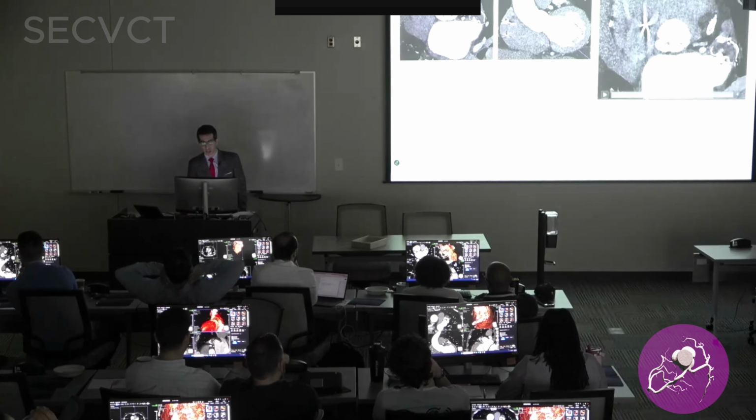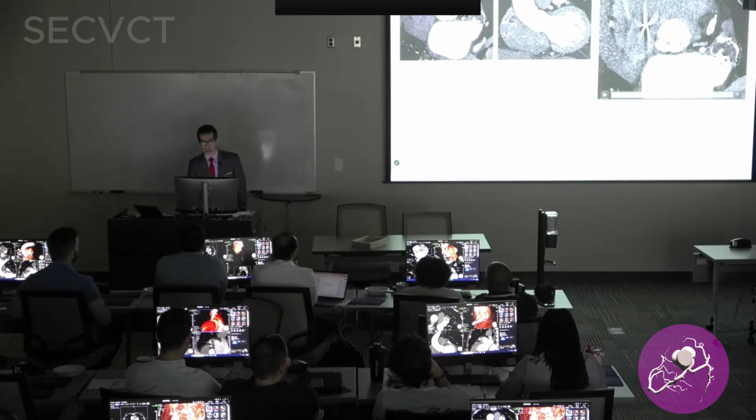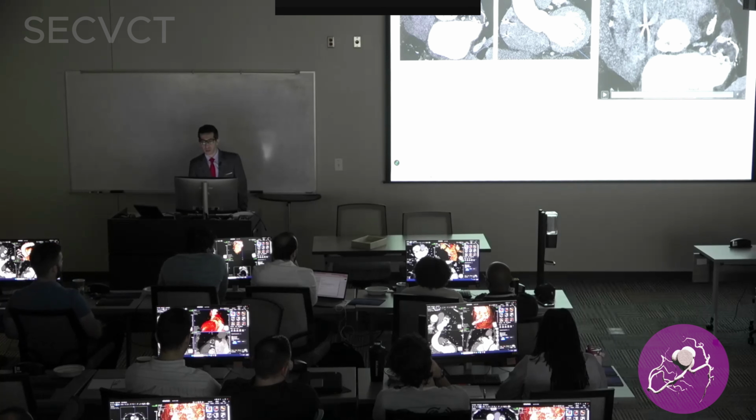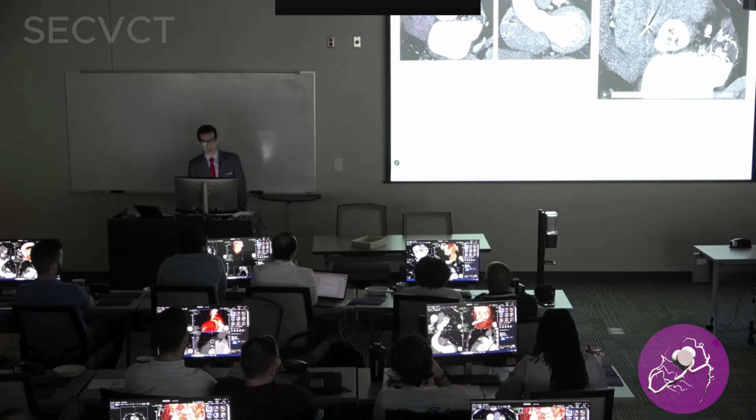By the way, this was done for aortic regurgitation. Unfortunately, the phase that was saved is the systolic phase. But I want to just point out to you, when we assess the aortic valve, go to diastole and understand the valve coaptation. So this is during diastole. You see the phase here. There's a large coaptation gap. So anytime you see that, you measure it on the CT.